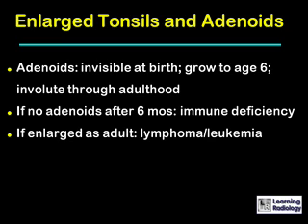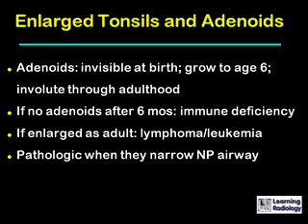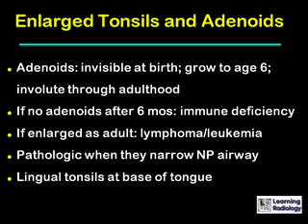lymphoma or leukemia. The adenoids are pathologically enlarged when they impinge upon the nasopharyngeal airway, as they did in this case. And they are frequently enlarged in association with enlargement of the paired lingual tonsils at the base of the tongue.